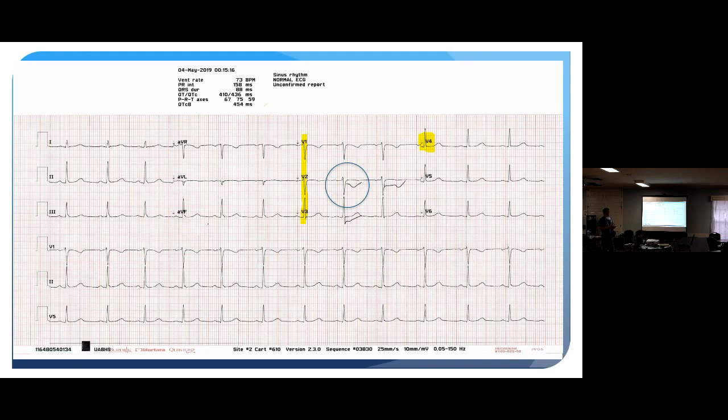So this is old school. When you printed one out, it was thin paper. You'd flip it over and look at it for ST elevation. You don't have to do that anymore, okay? Depression there is a STEMI.